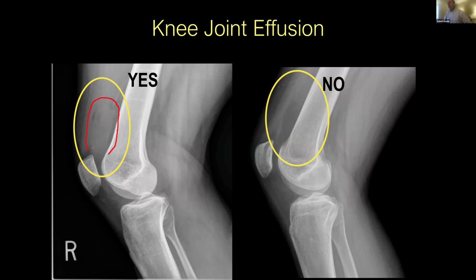And it has been said that if you see this soft tissue density in this location that's more than a centimeter, an effusion is present. If it's 5 to 10 millimeters, there's a possible effusion. This patient over on this side does not have any substantial effusion. There's probably a lick of fluid right here, but not much at all.